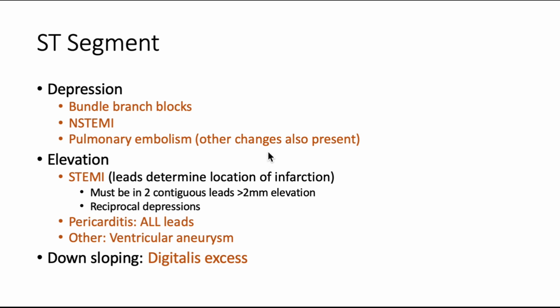Now, our big one is our ST segment elevations and depressions. Now, I do not want you to ever look at an EKG and only identify the ST segments. This should be one of the later things that you're doing. However, your eyes are automatically going to kind of turn to that. If you're in an emergency room setting, that may be the only thing that you're looking for, but do not let that stop you from seeing the other things that are underlying in that EKG.